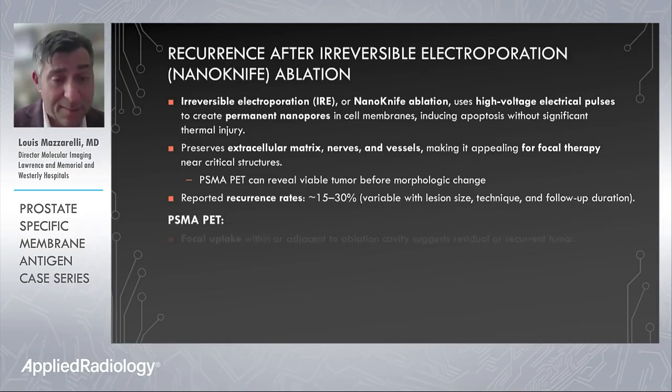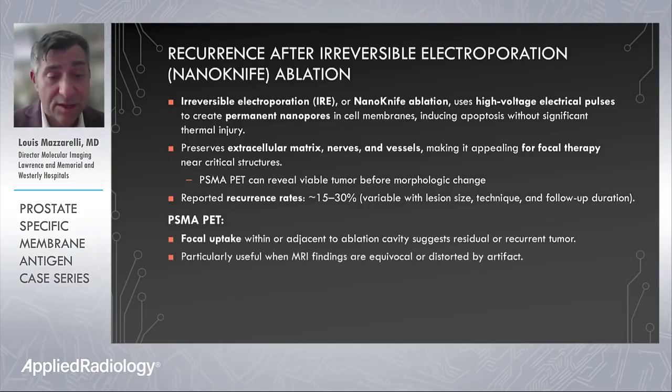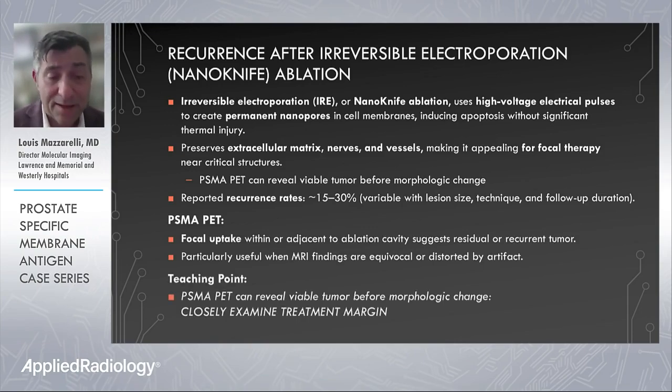The role of PSMA PET demonstrates focal uptake within or adjacent to the ablation cavity, suggesting residual or recurrent disease, particularly useful when MRI findings are equivocal or distorted by local artifact. The teaching point is that PSMA PET can reveal viable tumor before a morphologic change, so closely examine the treatment margin.